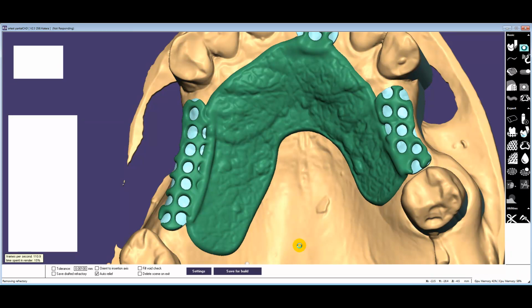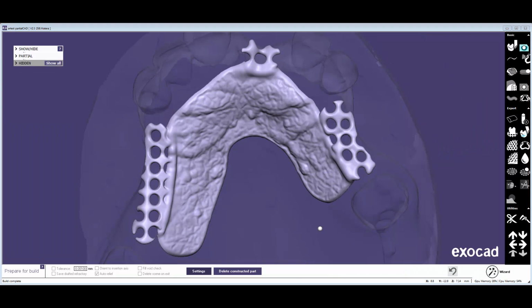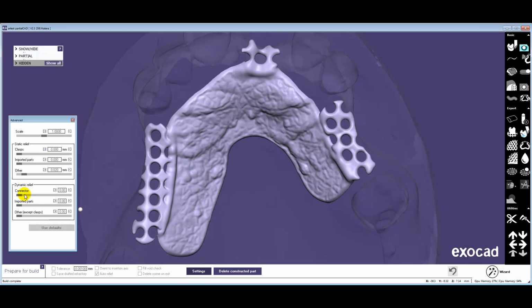So that has been fixed. It was a silly problem. We used to have more sliders there, and I combined them, but I made a mistake. So the relief under the major connector was not changing. Okay, so it's finished. So I had set it to 20 microns.